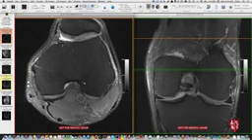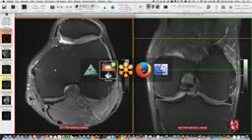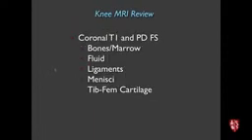So to summarize, that's like 30 minutes of a search that hopefully would only take about 2 minutes if you're systematic about it. But that tends to be what I do. We'll look at some cases here, but let me just go back real quick. Again, I'm not trying to indoctrinate anybody by saying this is the best thing to do, it's just an approach. So I look at the coronal images for the bone marrow, fluid, ligaments, menisci, and then the cartilage in the compartments.